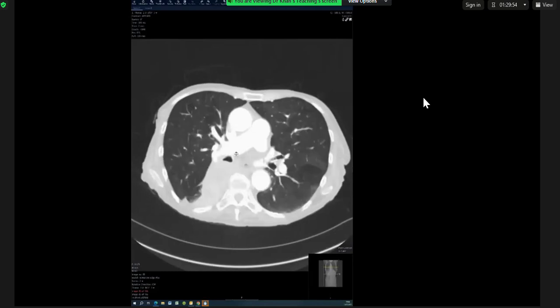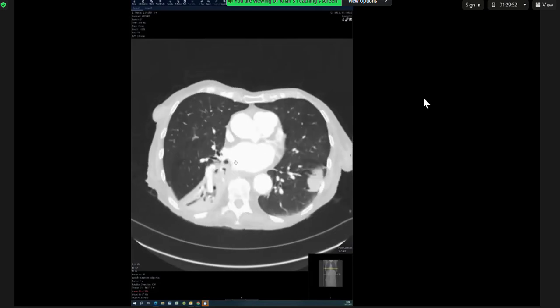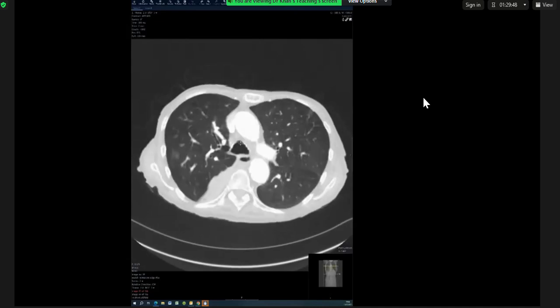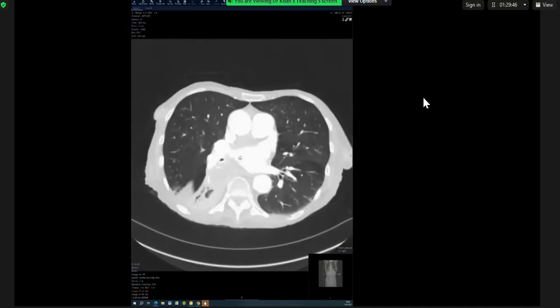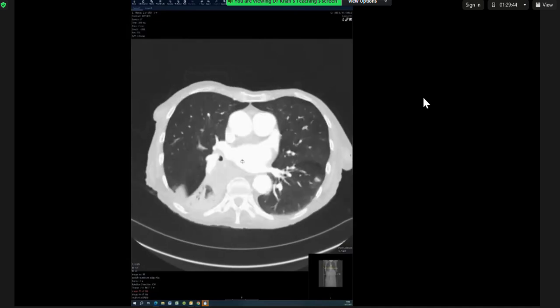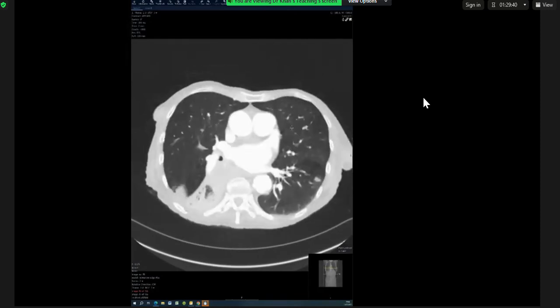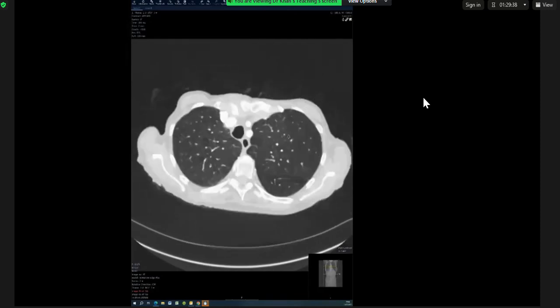But in this case, you would say, I see compression of the airways with occlusion causing distal collapse. The patient needs endobronchial sampling and wash to establish an underlying diagnosis. But that's the primary, and this one is the MET.